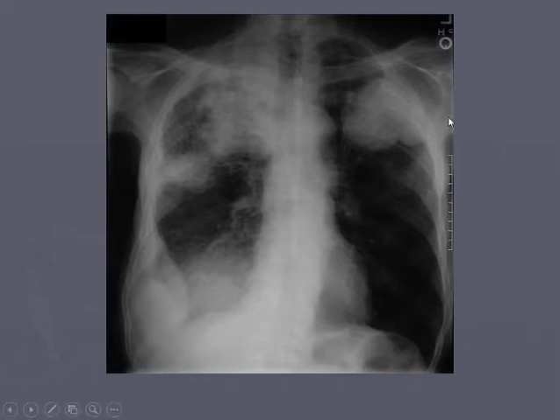So just to go through our pathway again, A for airway, we see our carina, nice and straight. Bones, our clavicular heads are flat, equidistant from each other. 1, 2, 3, 4, 5, 6, 7, 8, 9, 10. This is actually a little hyperinflated because we're seeing a lot more bones, and hyperinflated fields typically indicate emphysema.